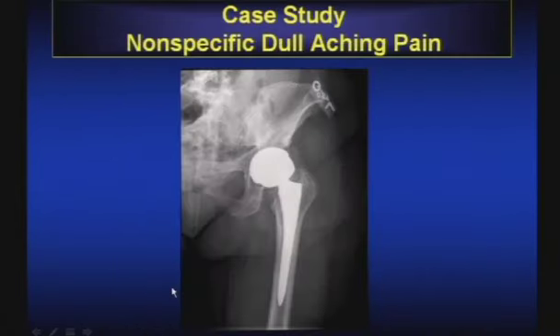Well, you might know about the next process that we're going to discuss, the complications of metal-on-metal total hip replacements, metallosis, this process is called, and why imaging around metal and decreasing susceptibility on MR is so important to a patient population that I think we are only going to see balloon in the next year. I mean, already we're getting quite a lot of requests for MR evaluation of these patients.